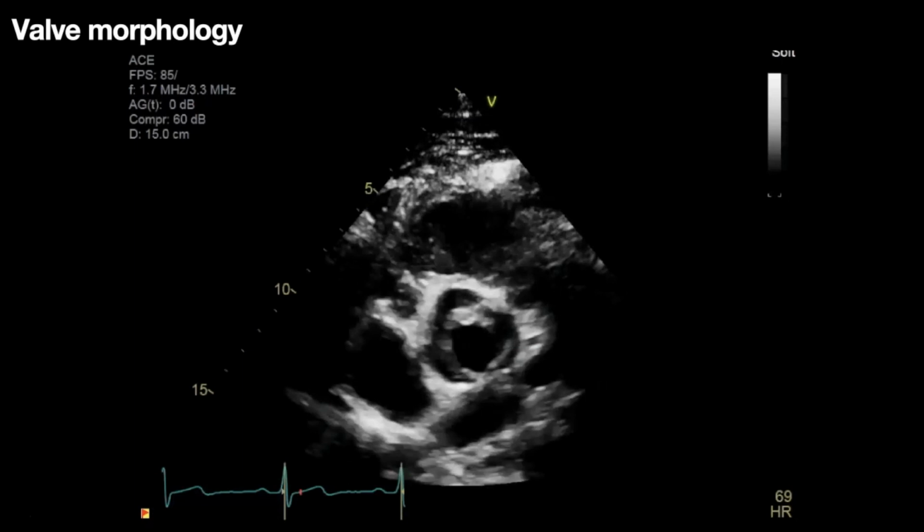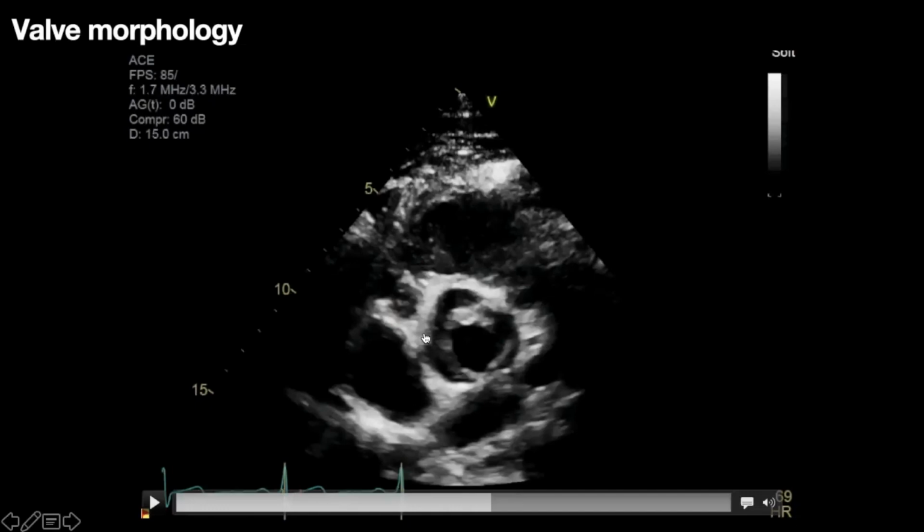No, you're totally on the money, Foti. So this is a type 2 bicuspid valve, hard to see for sure on the echo. And so it acts as functionally unicuspid. So to your point that you're suspecting unicuspid, this one has two raphe. So that defines the type 2. There's a raphe between the right coronary cusp and non-coronary cusp, and another raphe between the right and the left, which gives you that appearance of a unicuspid valve.